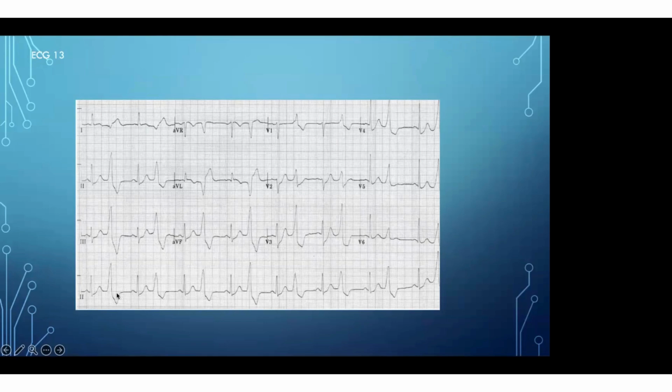This is a ventricular arrhythmia. There you can see a broad complex ventricular beat. This is a narrow QRS which is conducted from the SA node to the AV node to the QRS. This is the conduction system.